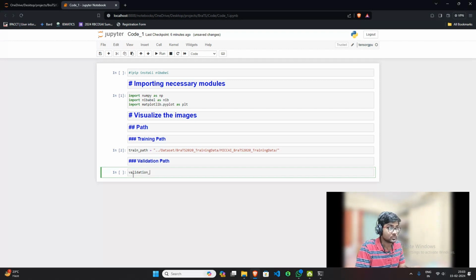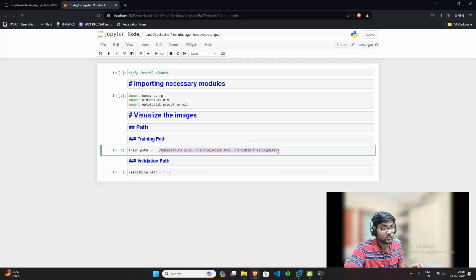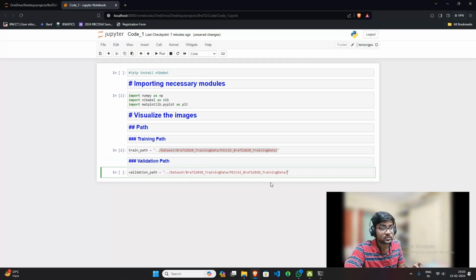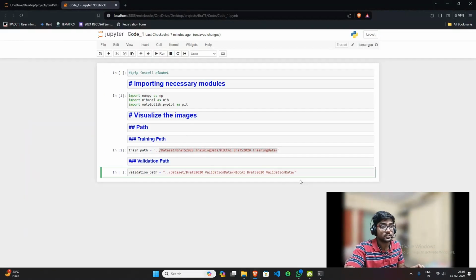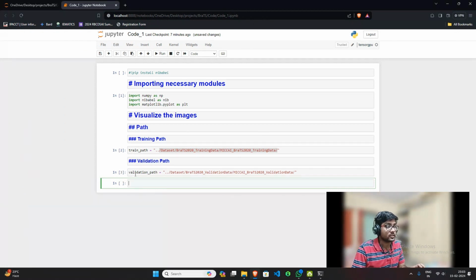The same thing will be there, just the difference is for this thing I think there's validation, and for this thing, I'm sorry, there's validation again. Am I wrong? Validation, yeah, same. Okay, so I think this should again run.